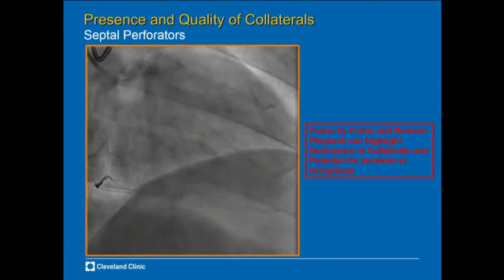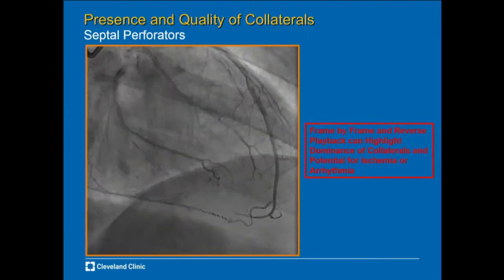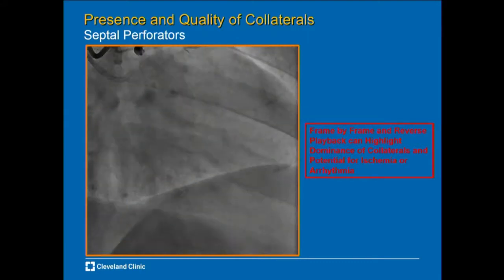So this is just a nice example of septal collaterals. I'm afraid to touch this mouse, but I think we should.